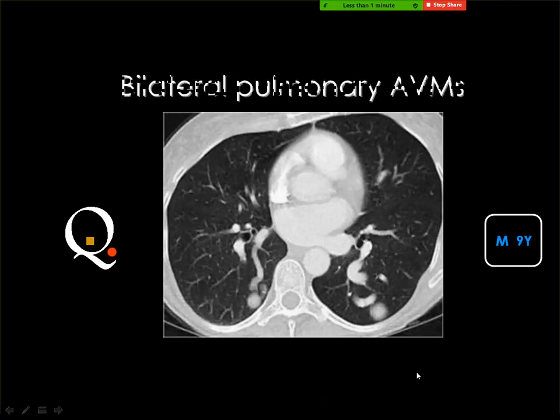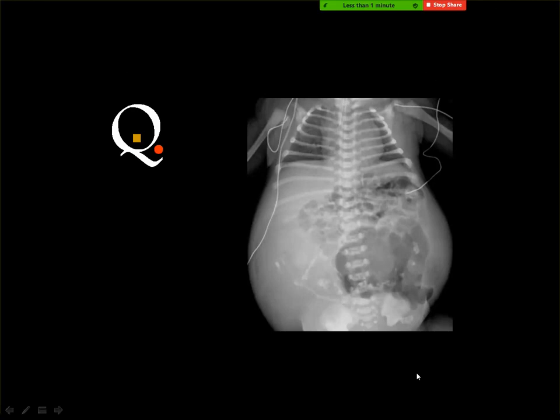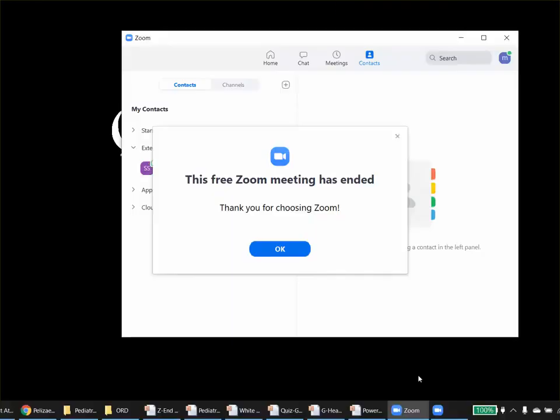Again. Bilateral pulmonary arteriovenous malformations. Okay, the time is over. Thank you very much.